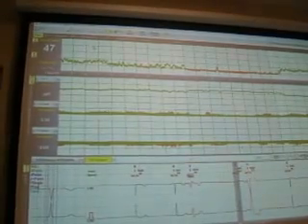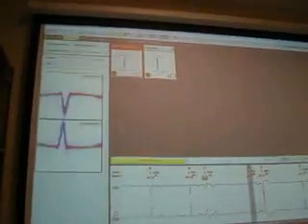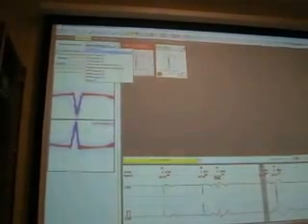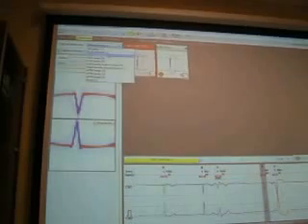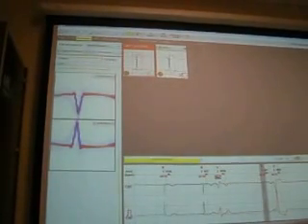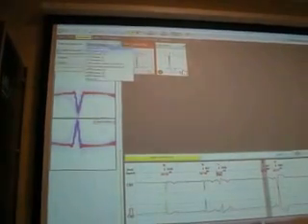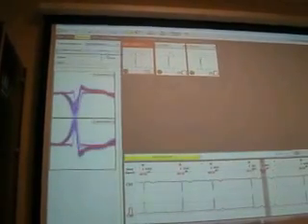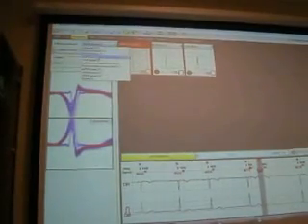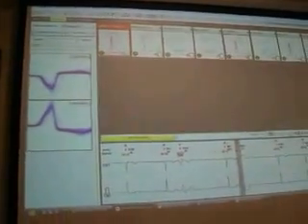We have to begin the evaluation with the templates. We can choose different template types. For example, normal beats. Normal beats are divided into two clusters. Supraventricular beats are divided into three clusters, and the ventricular beats are divided into 8 clusters.